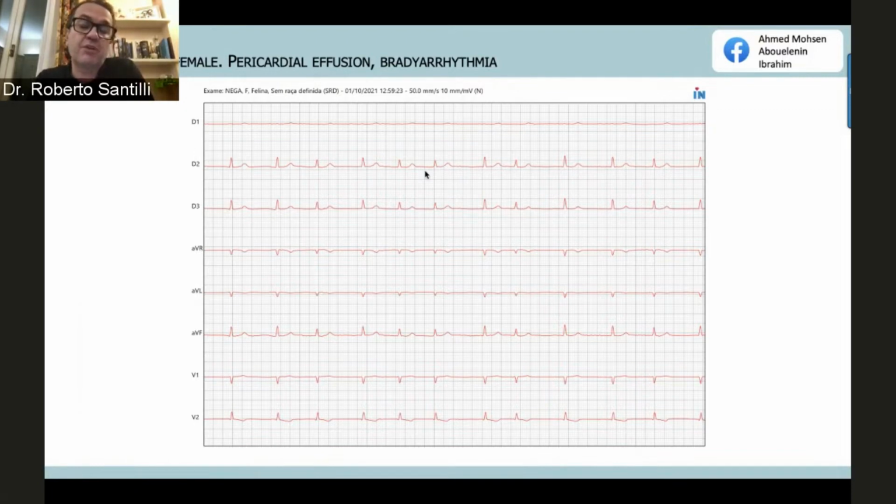So my final diagnosis is atrial fibrillation with slow ventricular response. It's quite rare in cats to have so slow a response, but sometimes with cardiomyopathy this can happen. The presence of this variation is mainly due to Brody effect. Why am I ruling out that this is due to the presence of pericardial fluid, which obviously can induce this change?